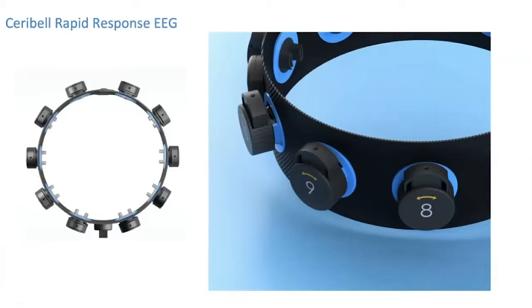The point I want to make, as we build up the understanding of what the EEG is, is that each of these electrodes makes a connection to the scalp and has to close a circuit. What I'm going to describe now is all basic high school physics to make this intelligible. But closing a circuit with metal across the skin requires some conductive material, and that's preloaded in the assembly you see in front of you.